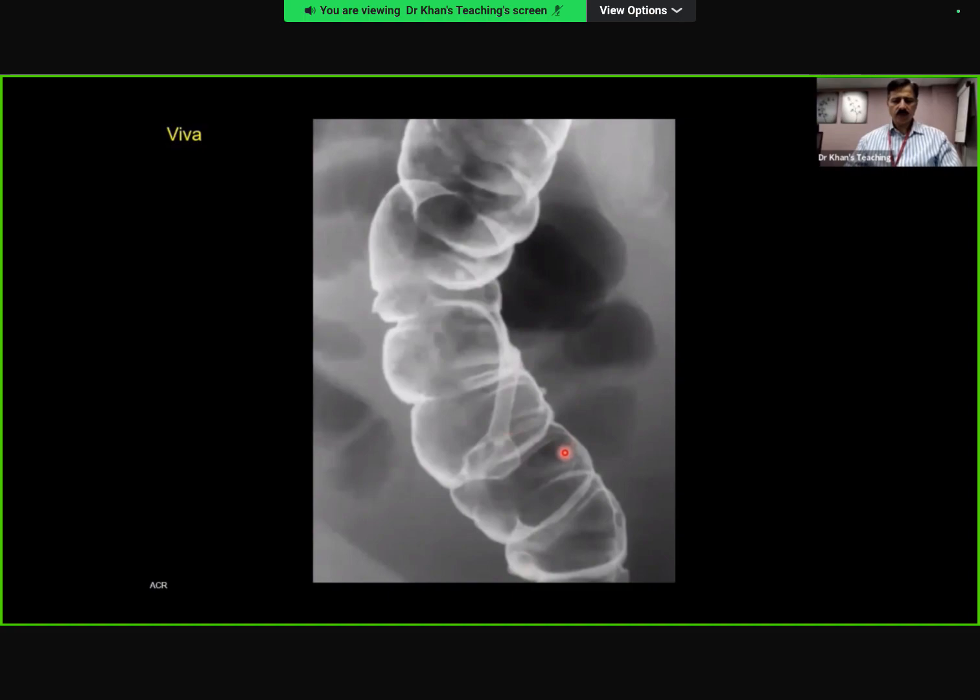That's the polyp with the pedicle. Okay, so what kind of examination has been performed? The barium contrast study. Okay. Enema. What do you know about the malignant potential of this? Is it more risk of malignancy or less risk of malignancy? These kind of polyps are benign. However, the sessile ones are malignant. Okay, good.